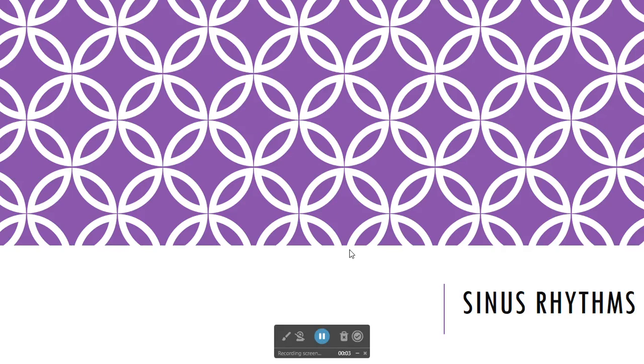This is a recording for basic EKG and sinus rhythms. We'll look at a basic rhythm, the waveforms, and the intervals. This is not a substitution for your online lessons. You must look at those for more details. This is just a brief overview.